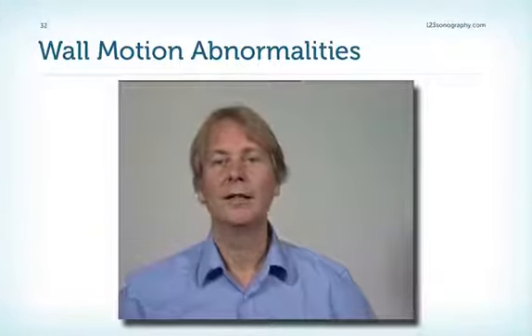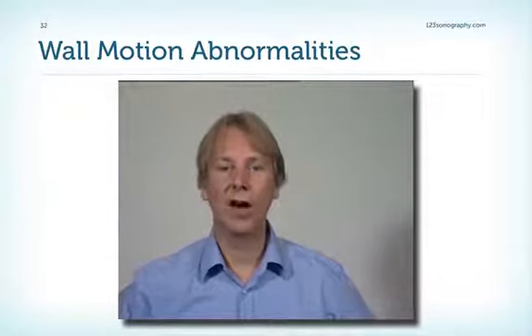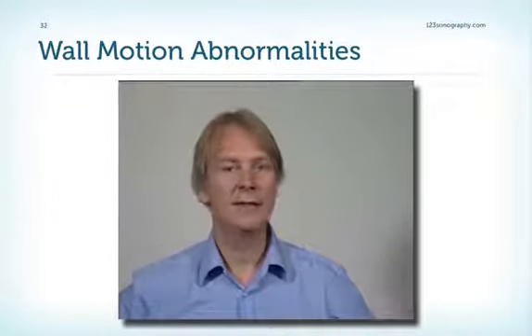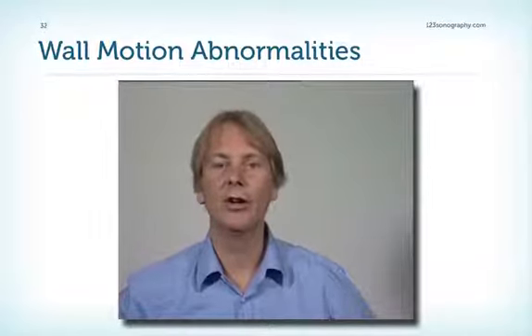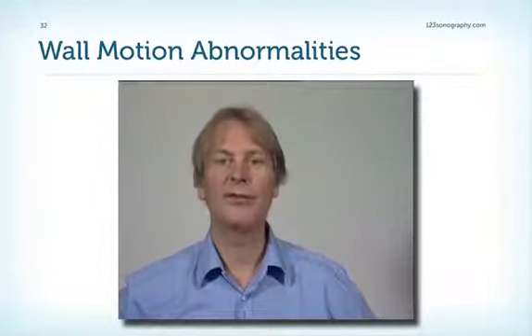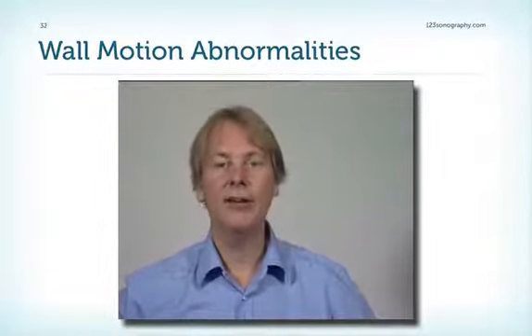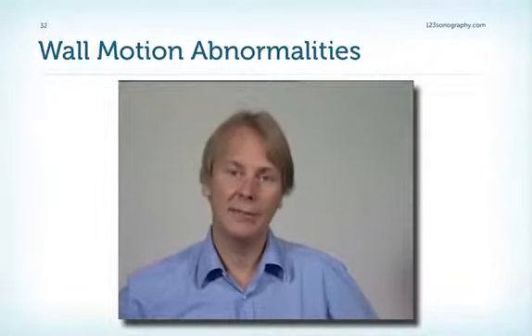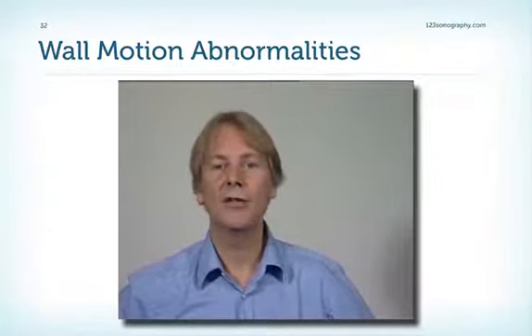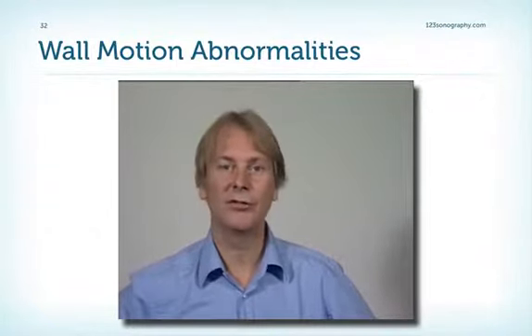So you see, wall motion abnormalities is a very complex issue. And keep in mind, it's not only hypokinesia or akinesia or dyskinesia, but there's much, much more. Think of all the factors and about the physiology behind it. And very important, always put yourself in the driving seat of the referring physician and the patient, of course, to get the most out of the exam and to answer the questions which are relevant.